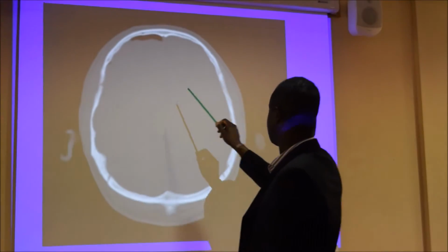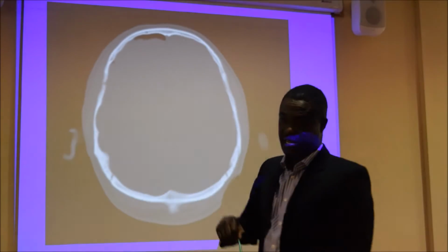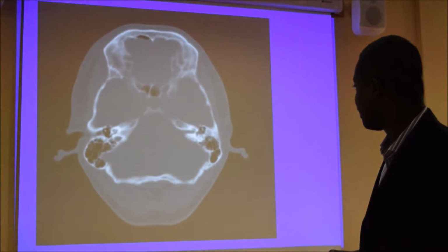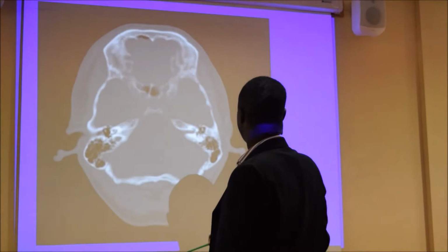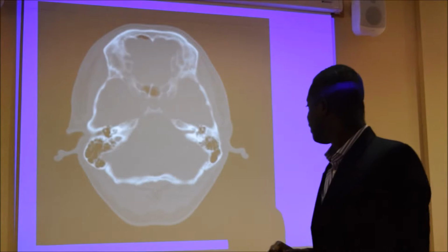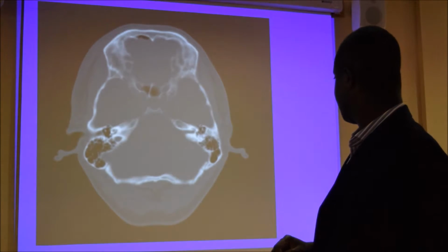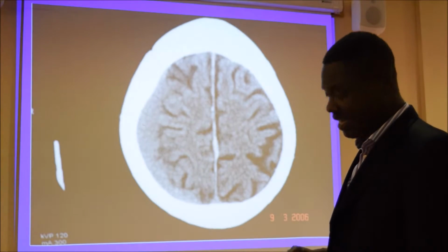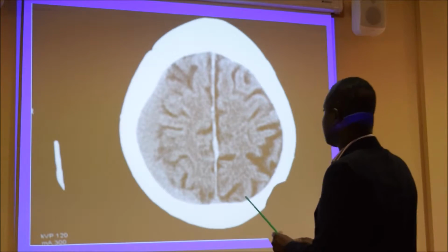And that's just the next slide up. You can see a lot more air in the patient's brain. The patient had a base of skull fracture. I thought I'd shown it on there, but unfortunately it's not on this image. Right, now with the densities, occasionally the densities may be very similar.